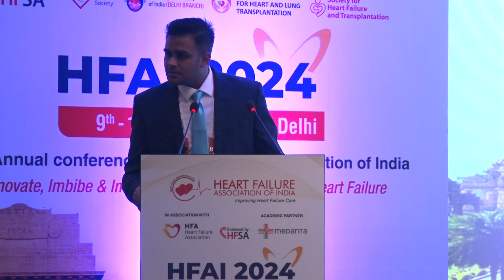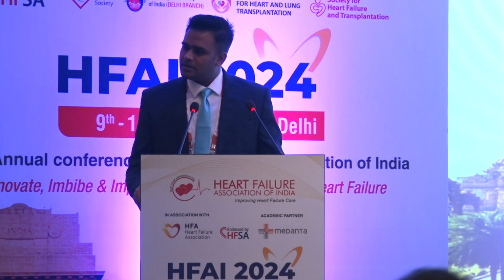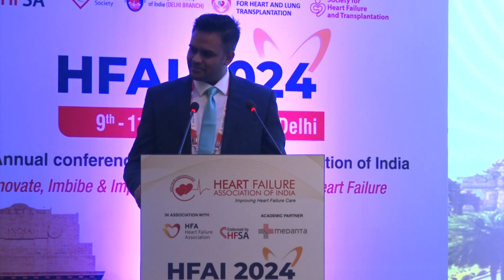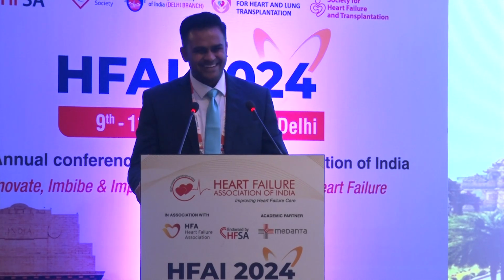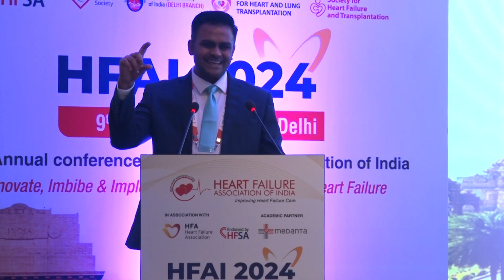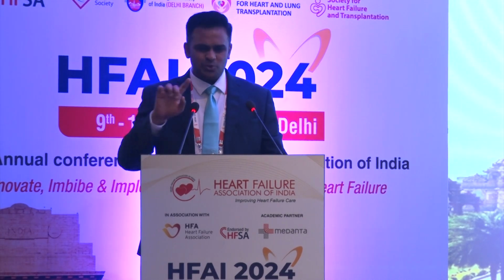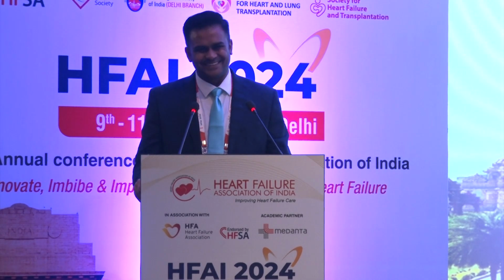You can't measure 5.5 by eye. Okay, but we do have a scale at the side. With digital X-rays, we have a scale at the side. Even if you zoom in or zoom out, the scale also zooms in and zooms out, so you can make those measurements.